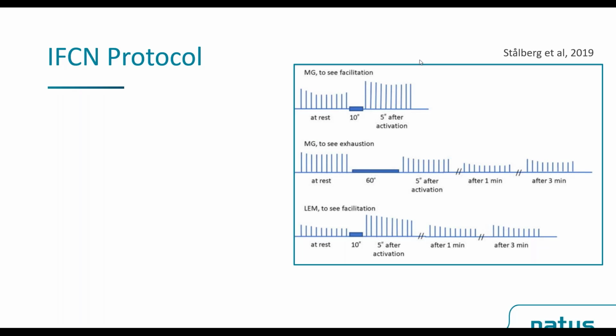And here is a wonderful protocol that is described in the IFCN guidelines. It was authored by Professor Stålberg, and I like this diagram very much. This is what we are trying to do in the EMG laboratory. So the protocol within the software is actually based upon this diagram.